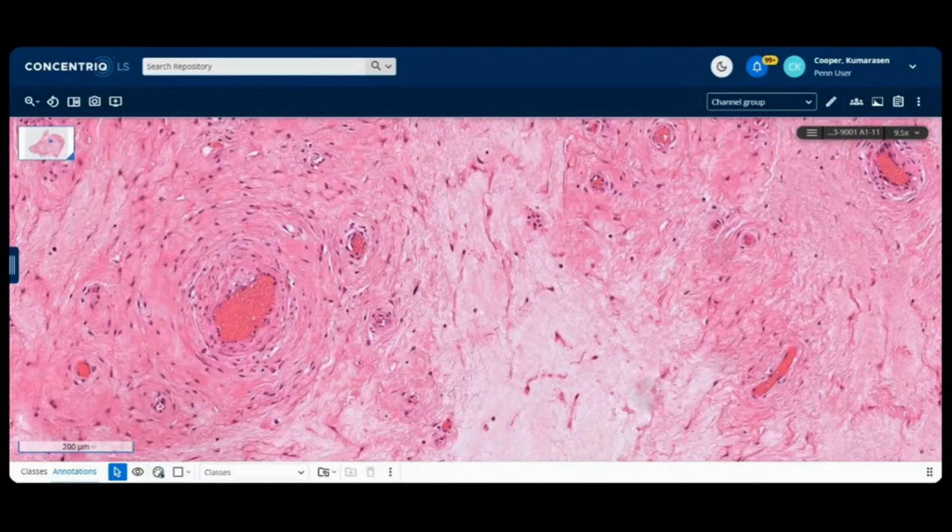But remember also, your oncologist or your surgeon would tell you that this is deeply infiltrative. It's not the superficial angiomyxoma that you see in the skin of the vulva. So this is going far deeper than that. And if you have the HMGA2 FISH, that's helpful.